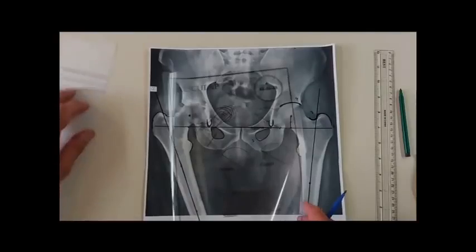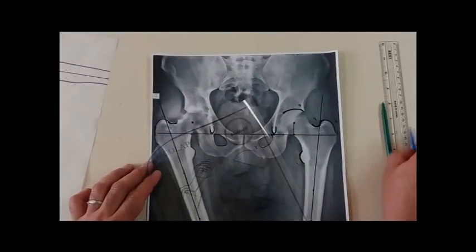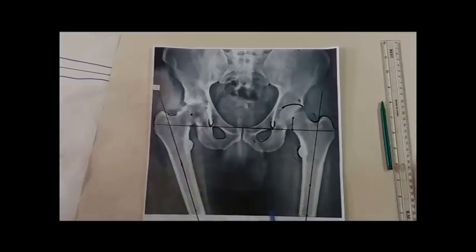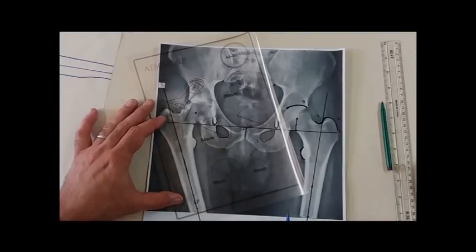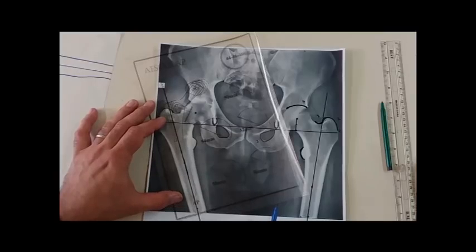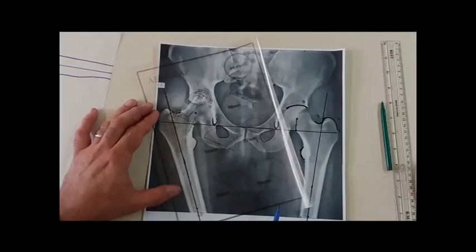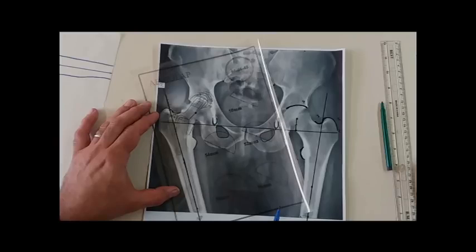I will take this template for the femur, for the AP, and I will align this longitudinal line in the template as I have described it just shortly, that this line should coincide with the longitudinal axis of the femur. That's to say, with this line. So I coincide this line with the stem together with the line of intramedullary. And I will start to shift the whole stem inferiorly, just as if I am doing broaching of the femur during operation. How much I will go below or up, this will depend on the following criteria.